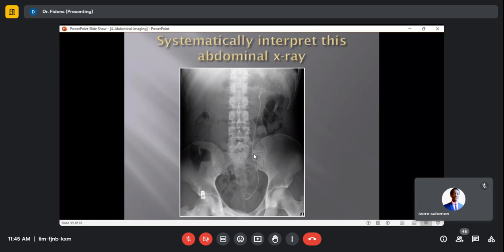The colon: ascending colon, transverse here, you can see this transverse, splenic flexure, descending, and rectum. And here, some of the bowel loops appear to be enlarged because of, can you see this fecal material? They are not to be seen this way. There is much fecal material. This is a case of constipation. That's the reason why some of the bowel loops are dilated. The fecal material is not coming out easily. It has been there for some time, and now proximally they are somehow dilated, but it is not intestinal obstruction.